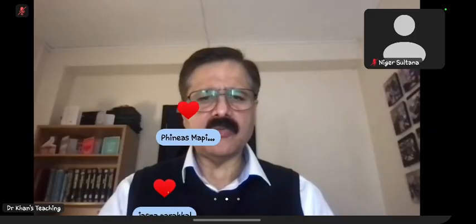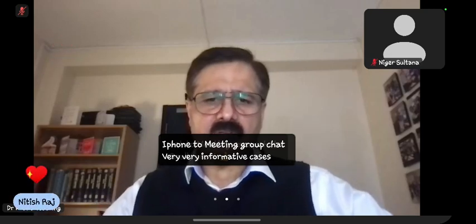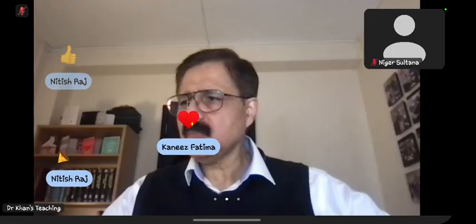But my idea is to do a lot of fresh cases which will really check you. So for the time being, I want to continue with this. Now, this is another very interesting case. Candidate 4, are you with us? Yes, sir.